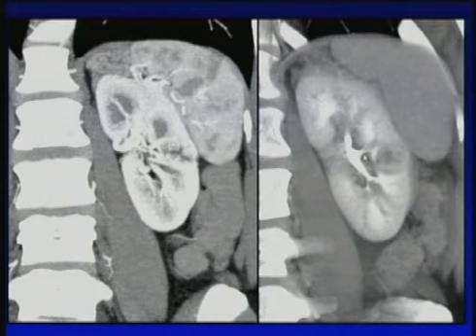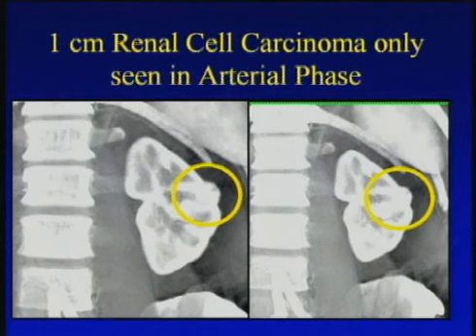So again, I think the point is well taken that there are potentially issues with certain small lesions in the cortical medullary phase. But again, when you get both phases, you're going to get the best of both worlds: lesion classification as well as optimized lesion detection.